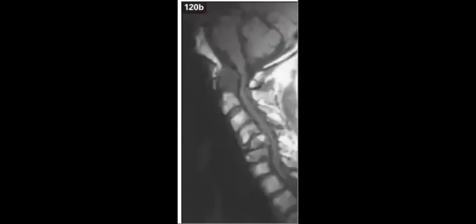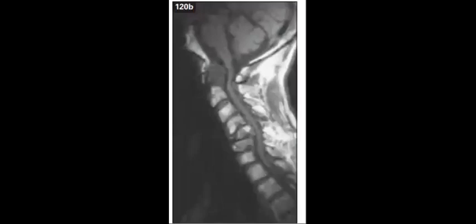And let me show you something in MRI for the atlantoaxial subluxation. So what happened here with this patient? Can you describe it? What happened with, again, this patient with atlantoaxial subluxation? What does he have here? Erosion of the dens with pannus formation.